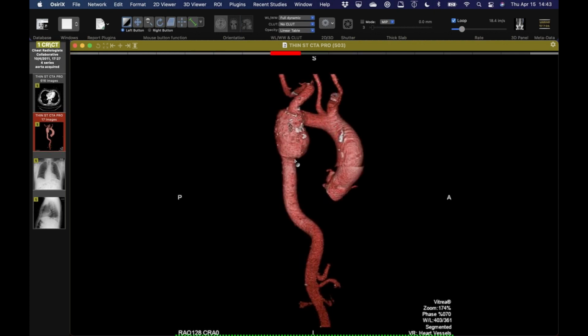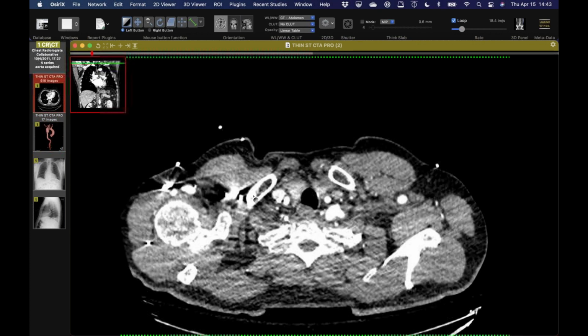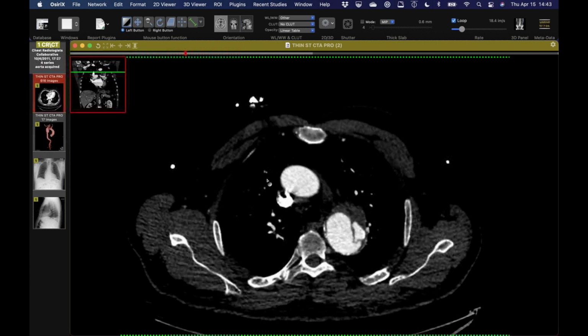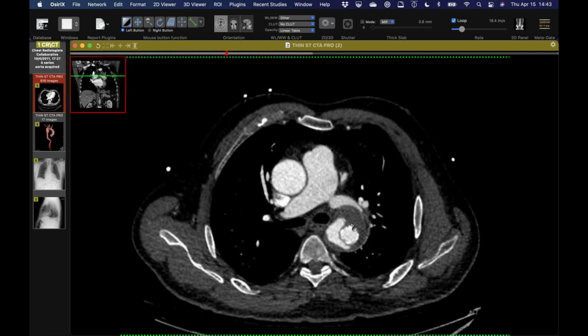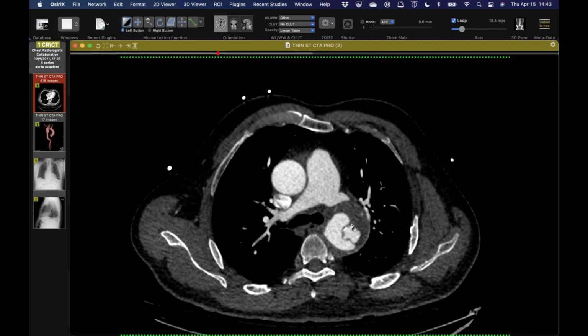He's got a heavily calcified aortic valve. It's thickened. So I suspect it's bicuspid or functionally bicuspid. And because I learned from David years ago what is associated with bicuspid aortic valves, it's coarctations, and this would be a good place for a coarct. There's no mention of it, but I dug through an old H&P, and there's mention of a repair of a coarctation at the age of 8 with no follow-up. And he never had sought medical care.